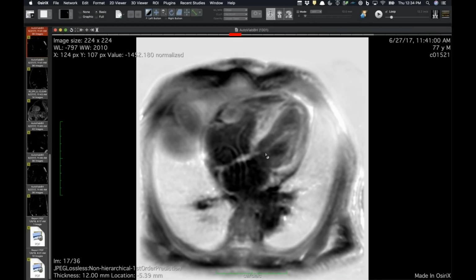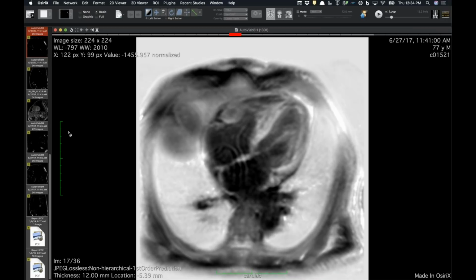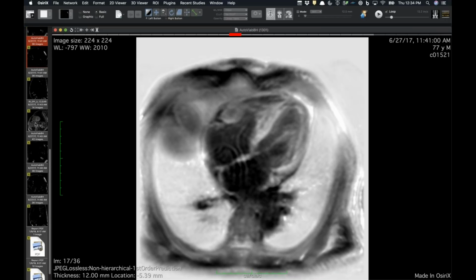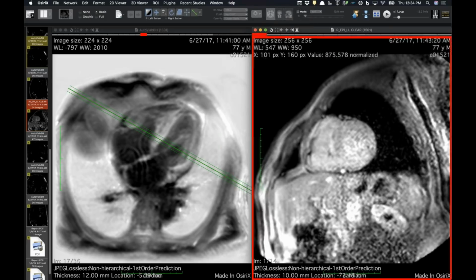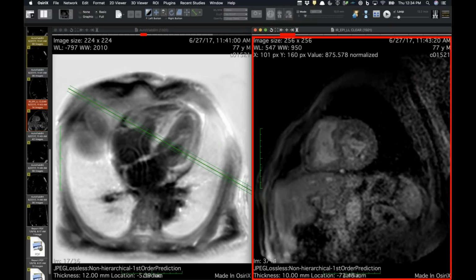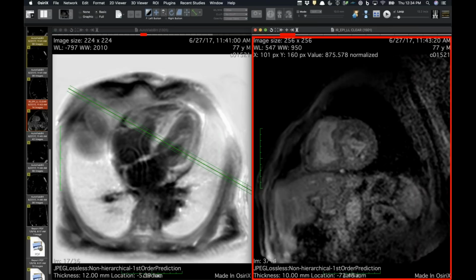This one's actually pronounced, but you have these cases where, especially in the short axis, you have these intertwined lines of white and black from the delayed enhancement in some areas of spared myocardium. And sometimes you get 4 or 5 different layers of it. And we do see those more in African Americans with ATTR.